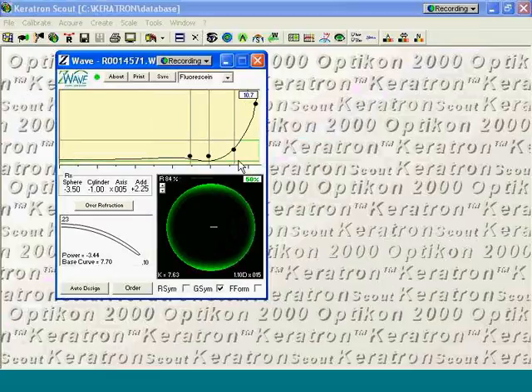Similarly, if we have this set at 50%, our lens design will be changed halfway around the lens. And you can control sectors of the lens design by setting this control to 100%, which affects all the way around, 50%, which affects half of the design, or 25%, which just affects one quadrant, as you make these control point modifications.